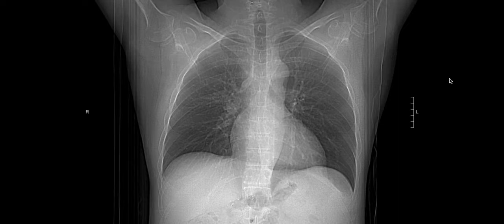It really is very similar to a radiograph. So it kind of stacks all of the information together, and some pathology and some things become a lot more easy to appreciate on the scout images. So it's very important, I think, especially at the beginning of your search pattern, to just make sure you take a look at the scout images. You can really see the bones very well. You can see some of the structures very clearly. This looks very similar to a chest X-ray, and if you do see something on the scout, it can also help inform how you go about looking at the cross-sectional imaging.